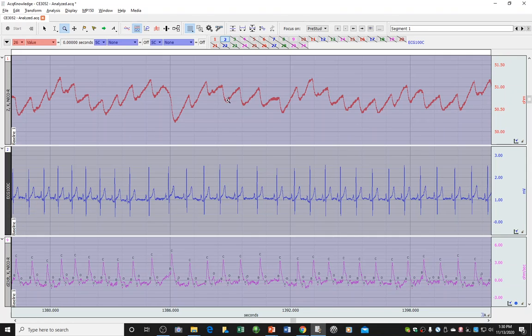And this is super helpful because when we take the derivative of this channel, we can see something that looks much more clearly like a cardiac cycle, which it is. It's just different measures of the cardiac cycle from what the ECG is measuring. These labels were not here. The BCXO or the BCXYO were not here. They had to be done after gathering the data in the raw signal.